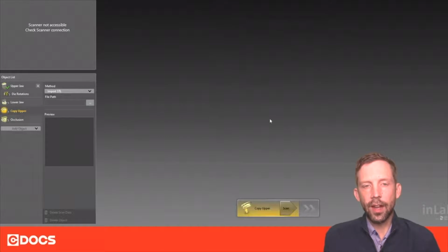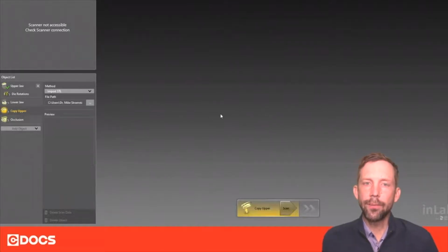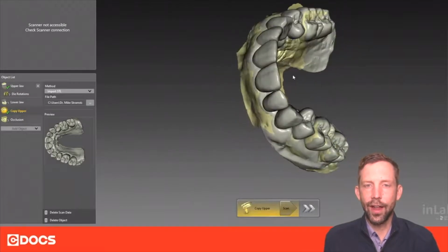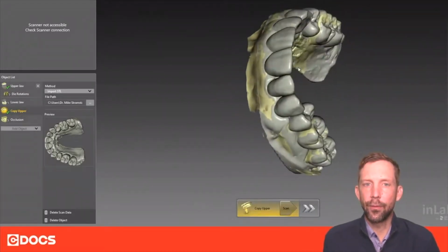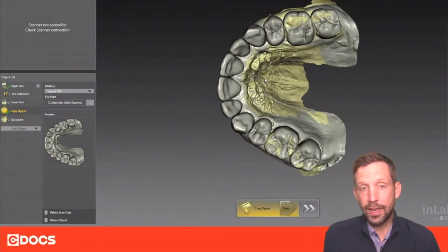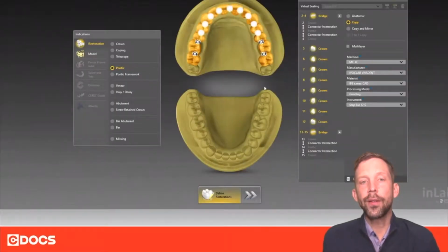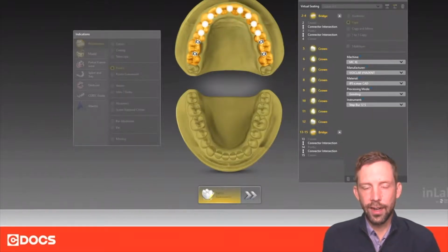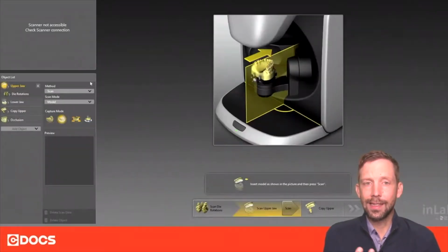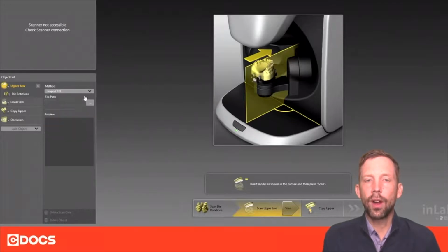Okay? Now you might be saying to yourself, okay, this is great, but you had a lot of stitching abutments on the posterior. You had like 2 teeth on either side. Impressive, but I can see that this should be pretty easy to do. Well, how about this case? Every single tooth on the whole entire upper arch. Now this has no stitching abutments besides the palate, but I want you to watch what happens.